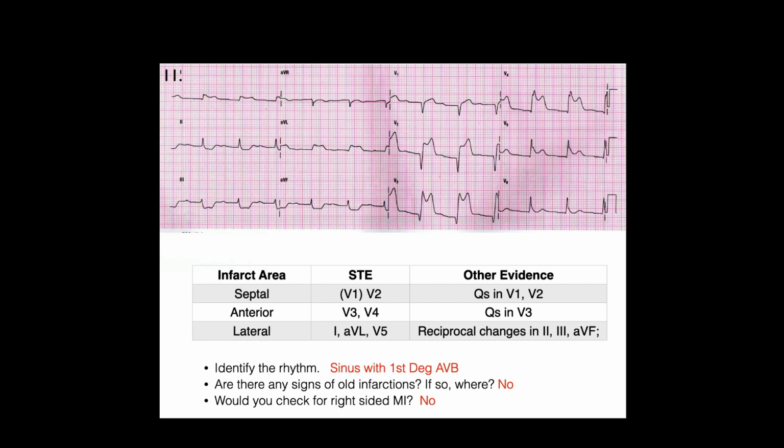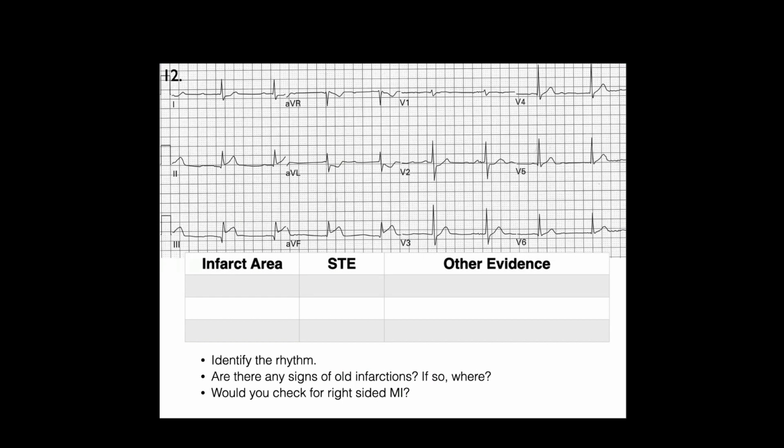Okay. The first degree AVB, I have absolutely no idea how you figured that out. Well, you find the P waves. Actually, lead 3 is a really good one for the P waves, and you measure the PR interval from here to here, and it's greater than 5 small boxes. Okay, yeah, they're just lengthening, that's what it's based on. So, first degree AV block has a PR interval greater than 5 small boxes. Okay, moving along. I'm sort of pushing us because we have to do the cardiac axis today, so we'll get this done. Okay, who's next?